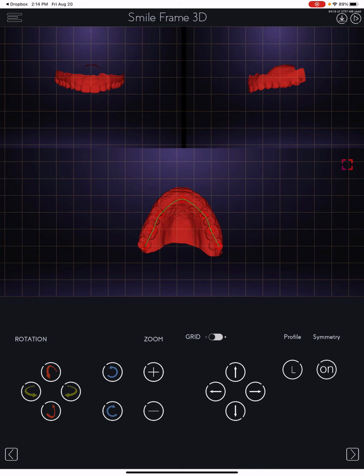And this calibration only happens once. From here, you can initiate, for example, a 3D design.